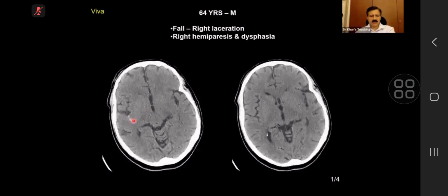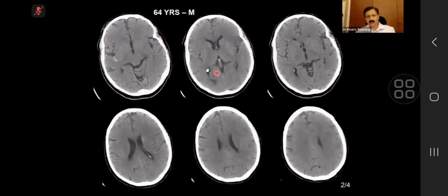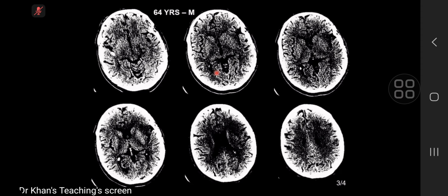There was subarachnoid hemorrhage in this case. Is there an acute infarction? So right-sided hemiparesis means look at the left. Looking specifically on the left side now at the basal ganglia, I have the impression that... So I'll give you a stroke window. Yeah, sure. So again, in the left insular region, there is an insular ribbon sign demonstrating an acute infarct.